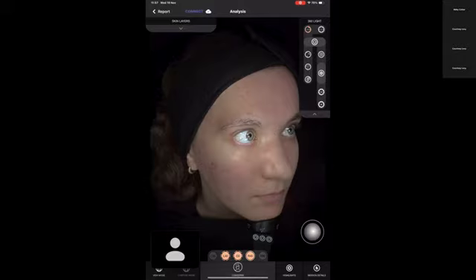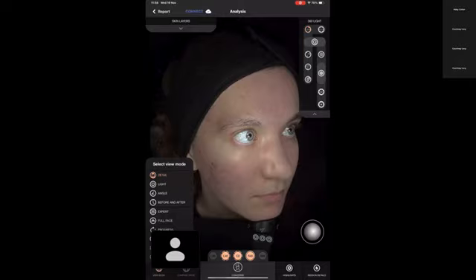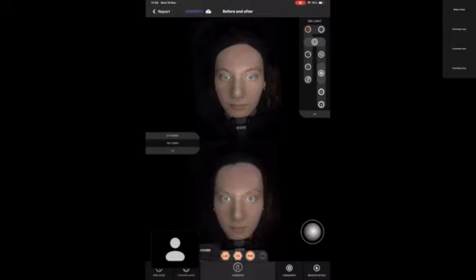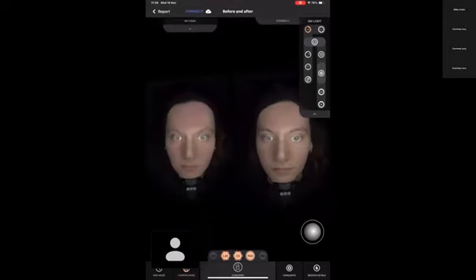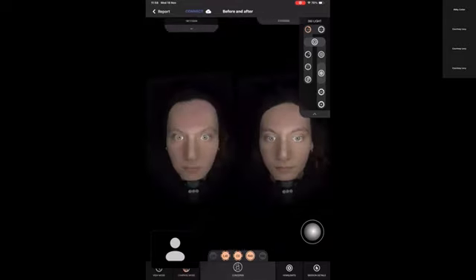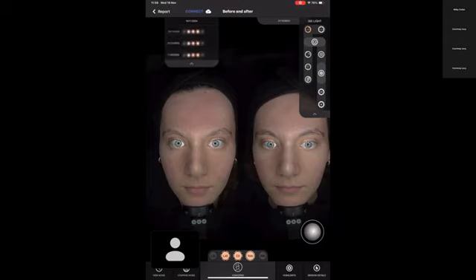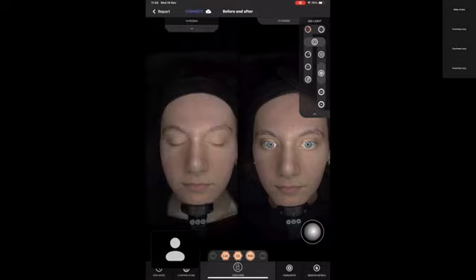So I now want to go and look at her treatment progress, because as we saw, she's had multiple treatments. So I'm going to go into before and after. And I want to go side by side because I find that the most useful. We can see here that we have one treatment being at the beginning of October and this one being in November. So I'm going to change this to be a bit more of a recent treatment from all of her dates that we could see before.